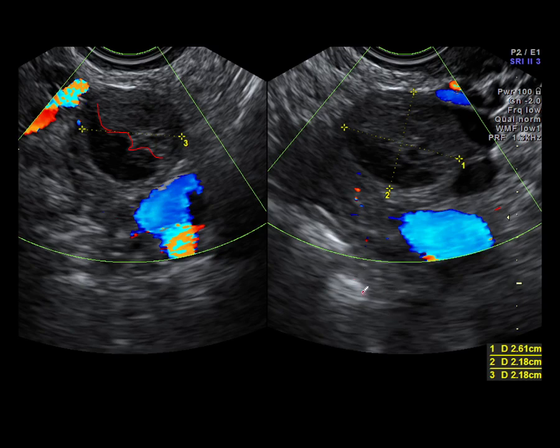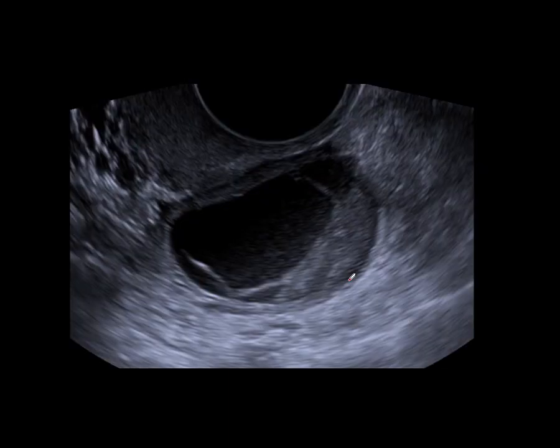That emphasizes another aspect of these scans. You've always got to look at the previous imaging to see how this may have changed over time. Here's another typical hemorrhagic cyst, a well-defined border. This is the only bit we can't see very clearly, the rest of it is very smooth. And when you see some malignant ovarian cysts later, you'll see the difference.